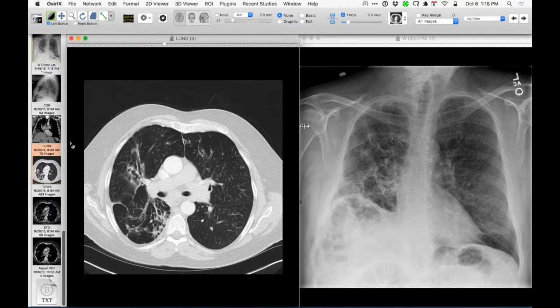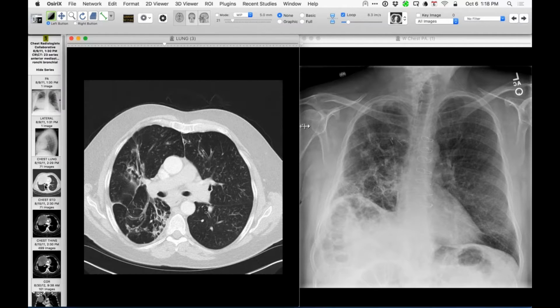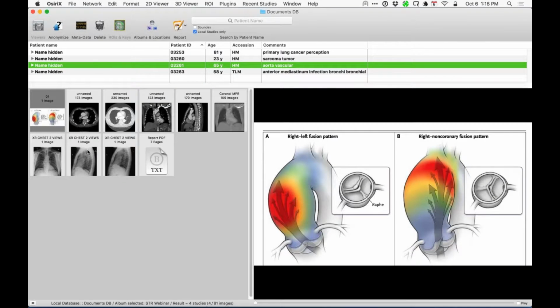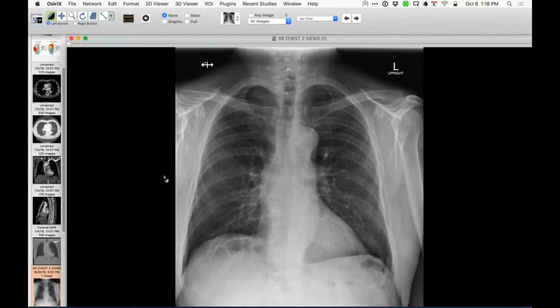So another one to add to the list when one sees a thymoma, in addition to, usually, myasthenia and red cell aplasia and so on. Okay. This one is just the notion of a vascular abnormality. So a case like this might start off something like this.